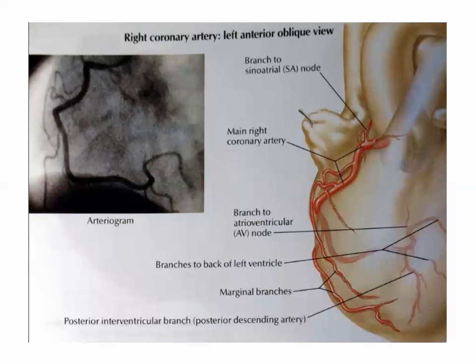As we said, what's this view? Left, yes. So left, LAO. Okay, so the LAO cranial or caudal? Cranial. Okay, so this is the diaphragm, so this is cranial, and the ribs are directed towards the spine. So what's this? This is the PL, to anastomose with the LCX, and this is the inferior wall, so the PDA, and this is septum, anterior, lateral, inferior of the LV.